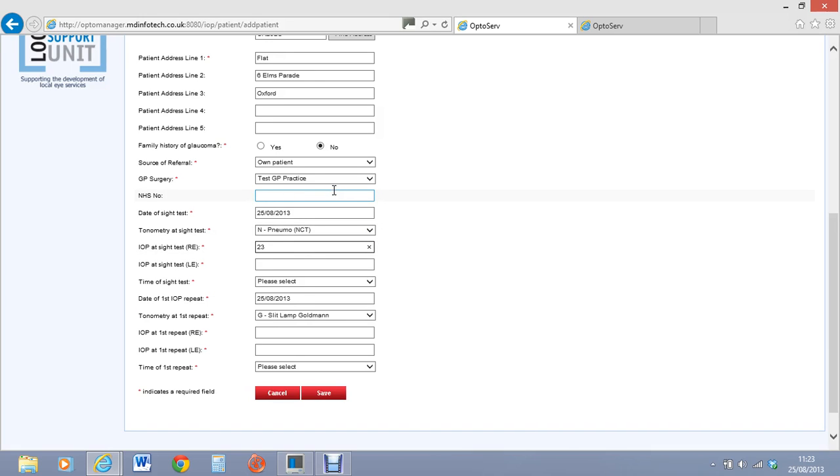So let's say I found with this patient 23 and 23, and it was at 12 o'clock during the day, and then I'd done the Goldmann, and it ended up being 19 and 19. And then I also did that 5 minutes later, so 12 o'clock that day. So that's everything filled in there. Now what I'm actually going to do is I'm just going to go back and change this to 20.